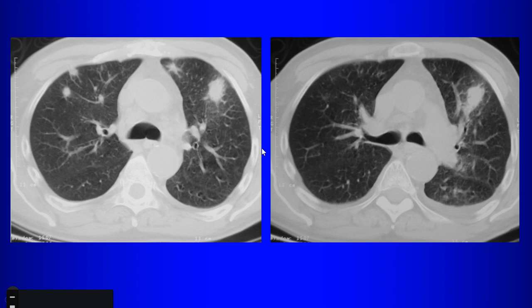Ground glass? Yeah, maybe there's some ground glass in the periphery. So you suggested infection or inflammatory. So what kind of things would you think about then? Why? What particular feature makes you think aspergillosis? Halo sign? What? Halo sign? Halo sign. You said there was ground glass around the lesion, which is a halo sign. So that can be so. And what form of aspergillosis would that be?